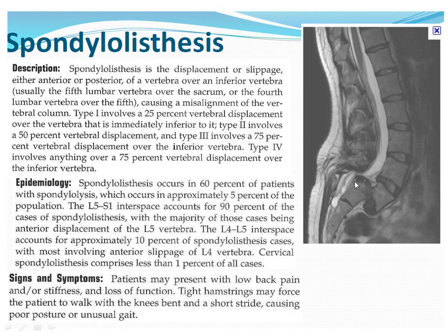of L5 on S1. So there are a few ways that this can occur. Many times, one of this severity would usually be due to a defect in the pars interarticularis, or just a pars defect as we call it. And those ones will usually be at the L5, S1. Pars defects are really common at L5, but you're also going to see this kind of less dramatic slippage with just facet disease, where the facet joints come in contact in the back. They can get really hypertrophied, and it can push the spine out of alignment in the front to back projection.